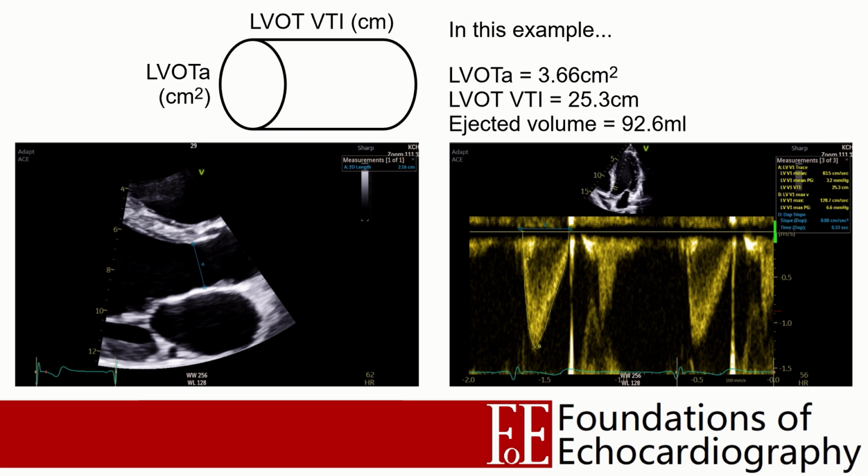In order to find the average stroke volume, we need to make repeated measurements and then average the obtained values. When the patient is in normal sinus rhythm and stroke volume variation is not excessive, we can use as few as 3 averaged beats. When the stroke volume variation is more pronounced, for example in a patient in atrial fibrillation, then we may need to average more measurements, typically between 5 and 10, depending on how great the observed variations appear.